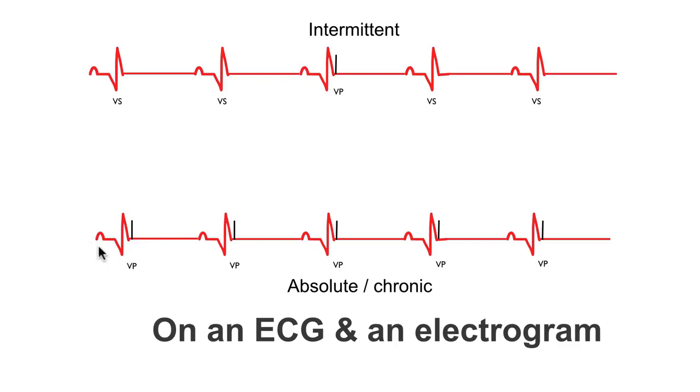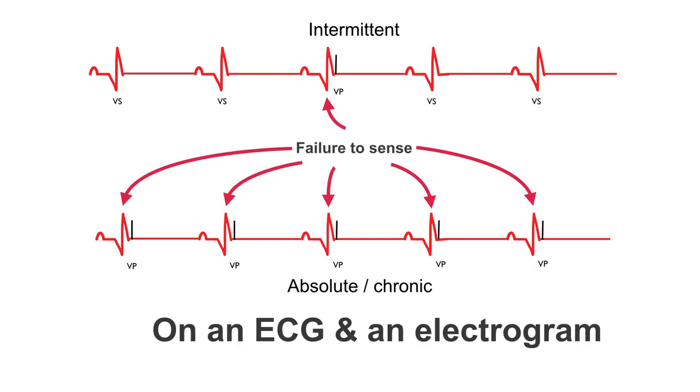In the example below, we can see that atria depolarizes, the AV delay is started in the pacemaker, and again, the ventricular depolarization isn't sensed. So just like the previous example, the pacemaker sends an output pulse. This fails to capture the now refractory ventricular tissue. This happens on all of the heartbeats on this electrogram, and so we would say that this is permanent undersensing, absolute, chronic undersensing.